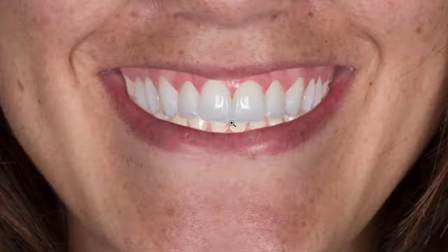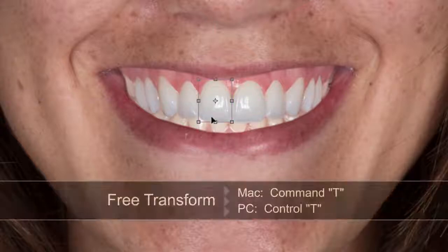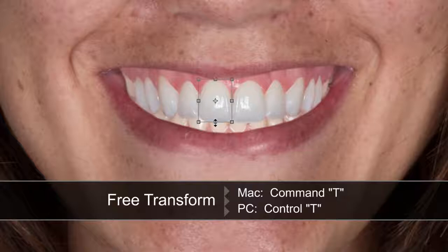All right, maybe we want the gingiva down just a little bit. So I'm going to just move that tooth down a pixel at a time. Let's zoom in so you can see what I'm doing. There we go, and I think you can see it now, so I'm just going to come down a little bit. Or if I wanted to change the aspect ratio, that was 80%, but maybe you want a little bit more rectangular shape, Command or Control T, and I'm going to bring that box up, and let's say that you just think you want to come down there just slightly.